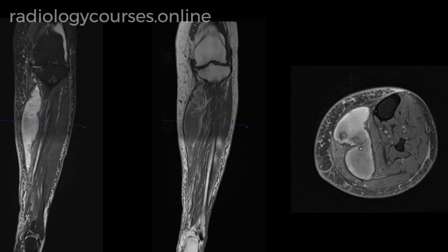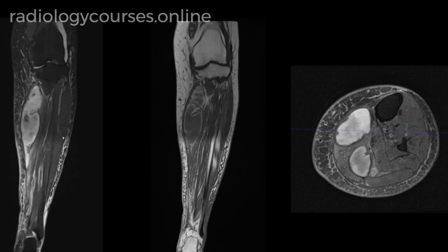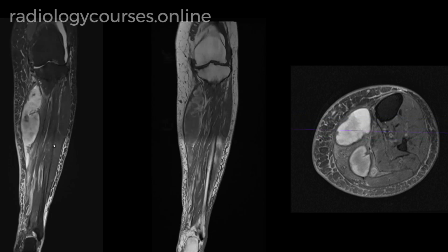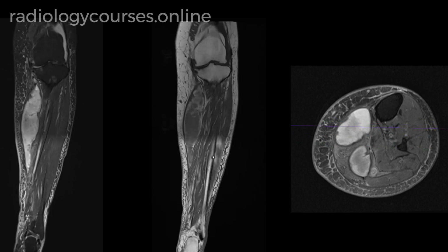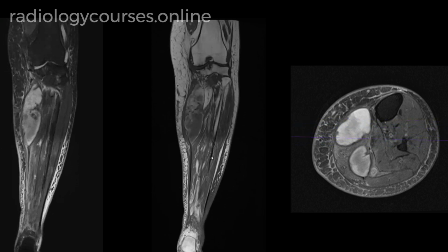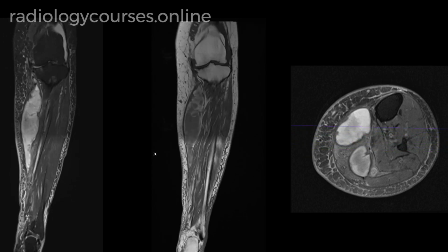There is no intra or intermuscular muscle edema, although there is mild subcutaneous edema. So looking at these features, they are very likely to represent a large hematoma. Features are unlikely to represent an abscess, but infection of a hematoma cannot be excluded on MRI. Post-contrast study may be of some use, but it will not really help to differentiate between hematoma and abscess without doing intervention.